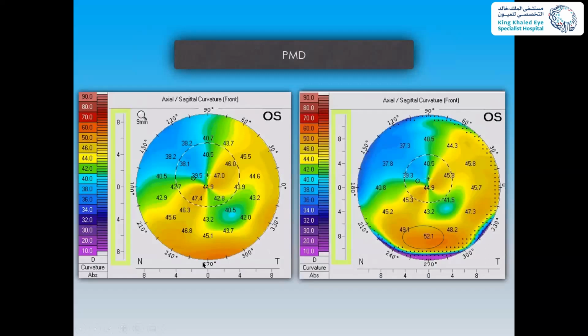And this is a good example in which we did an 8, and this is 8, and this is 12. Yeah. So here you cannot see that cone or elevation. Look here, you're seeing 45. It may be somewhere there, and suddenly, hooray! Here we go. We got 52.1.